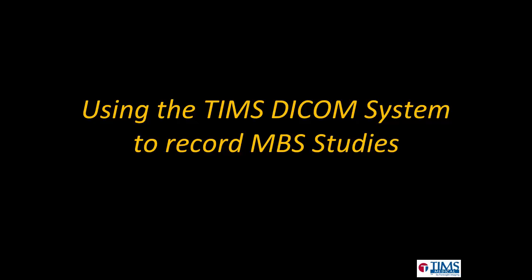Welcome to a brief presentation of using the TIMS DICOM system for recording modified barium swallow studies. The first part of this presentation will take a look at how TIMS compares to other recording solutions, an overview of the TIMS system itself, and then we'll take a look at some of the flexible workflow options TIMS provides. The second part of the presentation is an actual demonstration of the TIMS system itself and its capabilities.